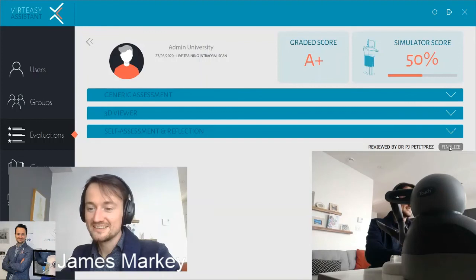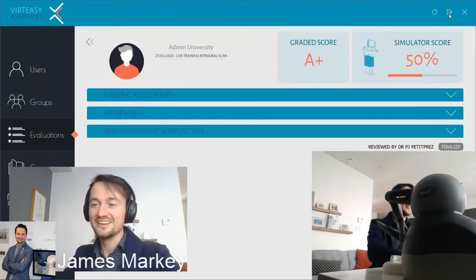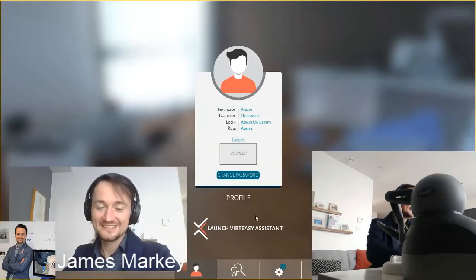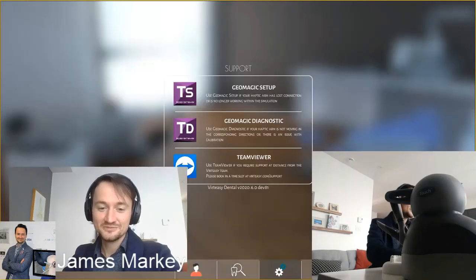Then lastly, the teacher can finalize all the results and send that back to the student. As you can see, I've already done that from here. So once I exit, that brings me back into Virteasy Dental, and that completes our workflow.